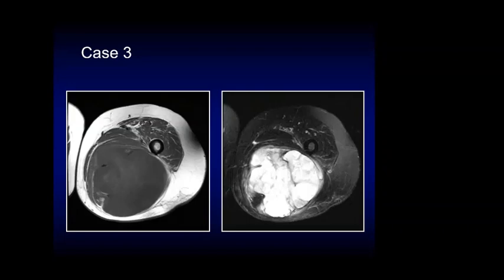Okay, so I'm going to give you three options: quadriceps compartment, adductor compartment, or hamstring compartment. Hamstring. Okay, so it's a hamstring. So the tumor is localized in the hamstring compartment, and we can see that the adductor compartment is displaced but actually not involved. And T2 axial is the best sequence for your local staging. So this is a large lobulated soft tissue mass situated in the hamstring compartment with no involvement of the adductor compartment or the quadriceps compartment.